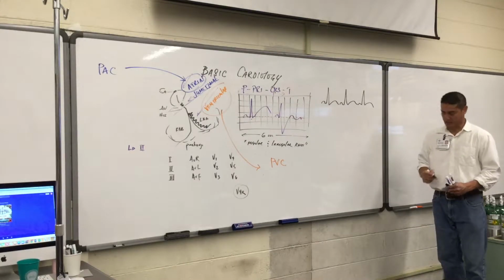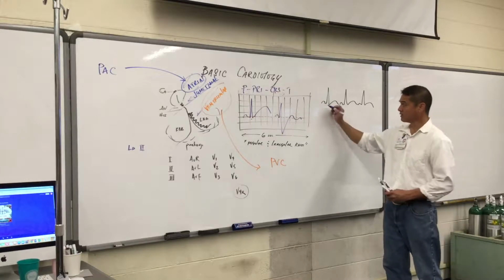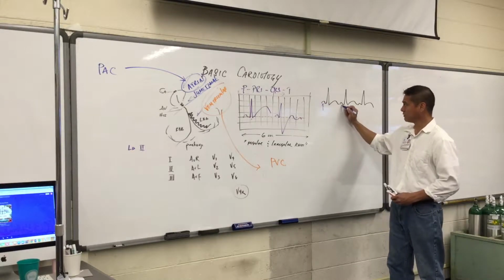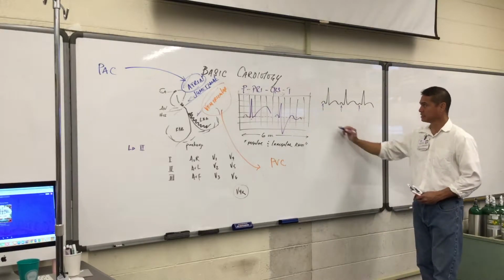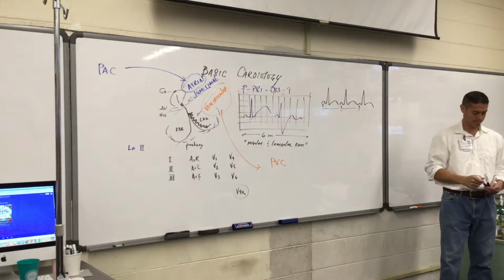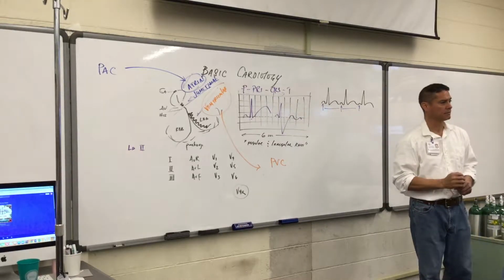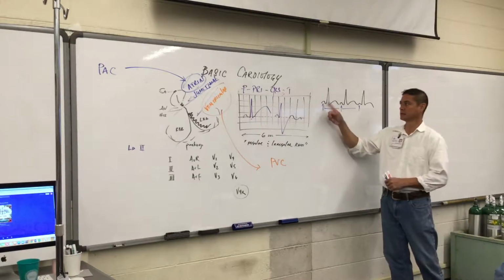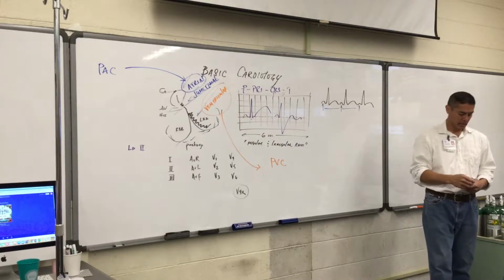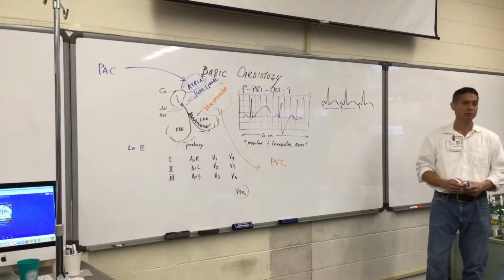So what we should see is that there's a P wave. When we have a tracing, we should notice that there's a P wave for each QRS. These P waves seem to have the same distance between them. The P wave is usually upright. It's before a QRS complex. It's not very wide or large. We should see a small little pause just before that. We know that's called a PR interval.